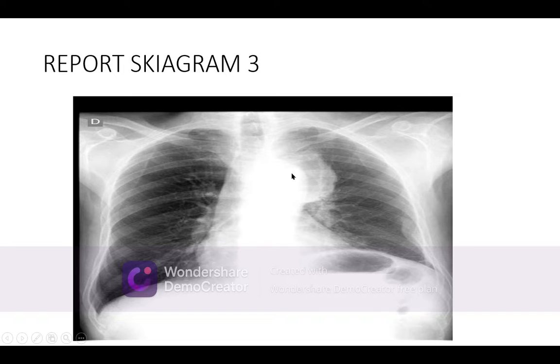So, inference: there is a soft tissue shadow in the superior as well as anterior mediastinum, part of it, and the border is slightly irregular. We don't know. We have to do the HRCT to confirm it and then go to the biopsy. And this is a sail sign in the plain radiography, thymoma. Thymoma is related with the condition which is known as myasthenia gravis.